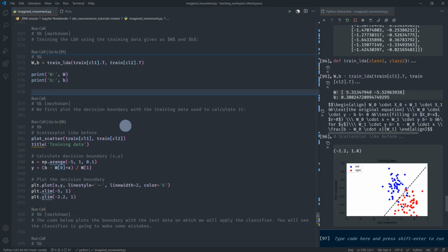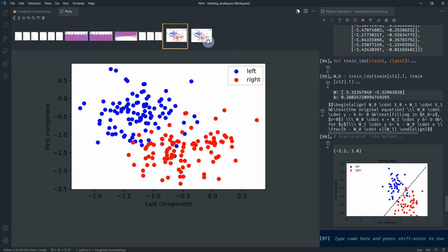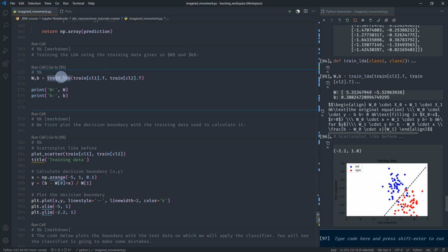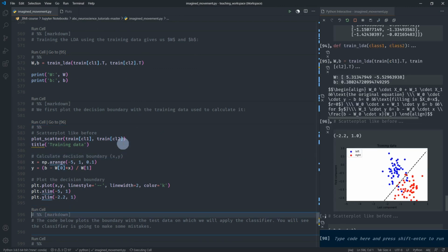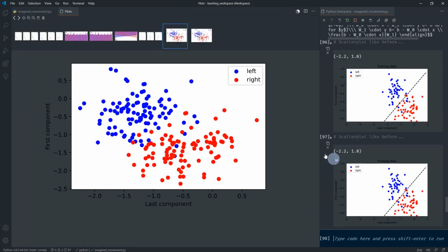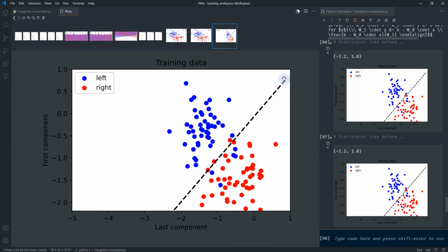It can be informative to recreate one of the scatter plots that we have seen, and then plot the decision boundary using the classifier we have obtained. Right? In this case, look, this is the scatter plot. Let me open these. Here the decision boundary is this line for which the classifier output is exactly 0. All others can be plus or minus. The scatter plot here used x0 as x-axis and then x1 as y-axis, two features.